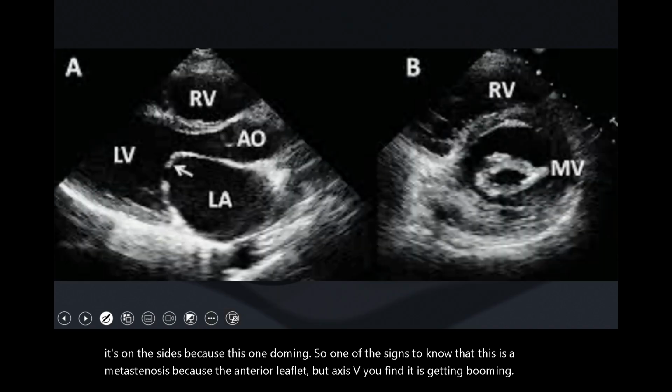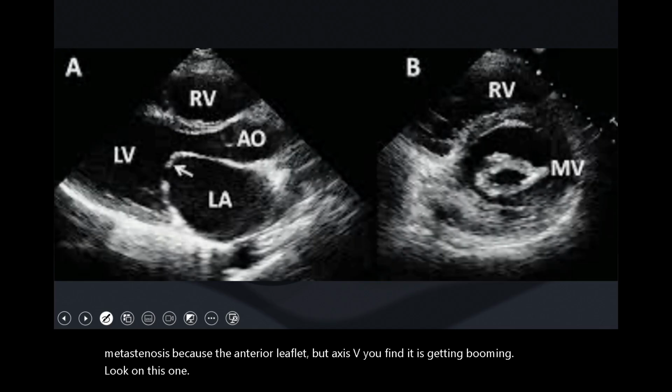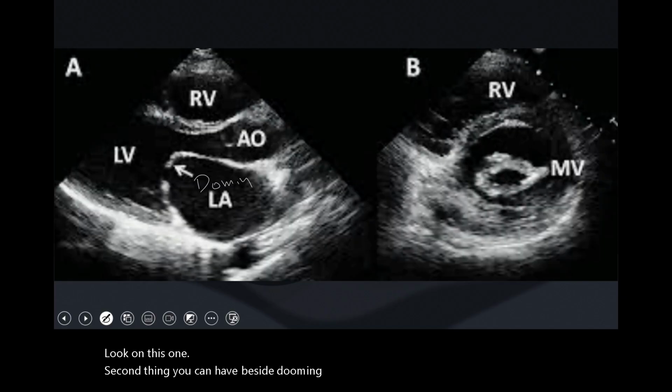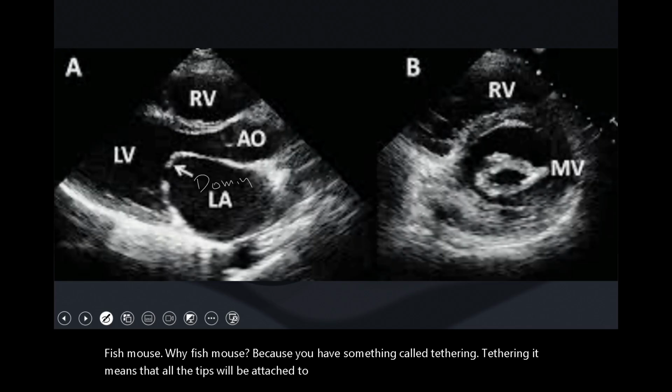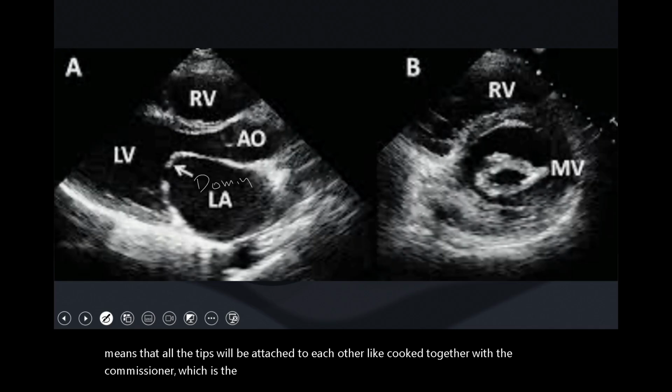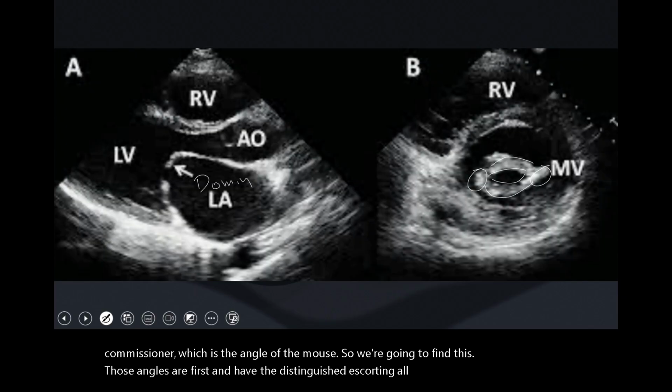Look at this one. The second thing you're going to have besides doming is the fish mouth. Why fish mouth? Because we have something called tethering. Tethering means that all the tips are attached to each other, stuck together with the commissure, which is the angle of the mouth. So we're going to find both angles fused with tethering, which is sticking all the tips together.